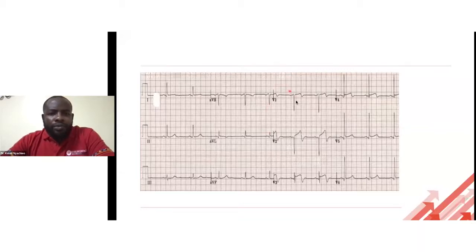When you connect him to the monitor, more or less vital signs are the same, are normal, sorry. And when you connect him to the ECG machine, you're not really seeing ST elevation. It could be there, but it may not be as obvious, okay? But what you're seeing is actually in V2, V3, we get this. Goes up, goes down.